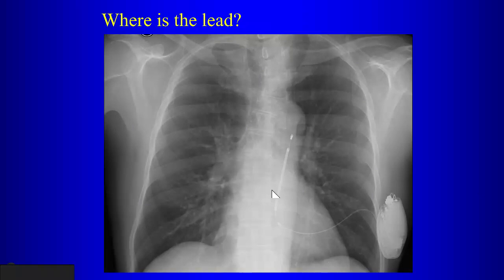Would it go up like that? It would go this way, yeah, right? Any other thoughts? First of all, is that a good idea, sticking holes in the left ventricle? Probably not. Yeah, not a good idea. No, not recommended. Any other thoughts as to where this might be?